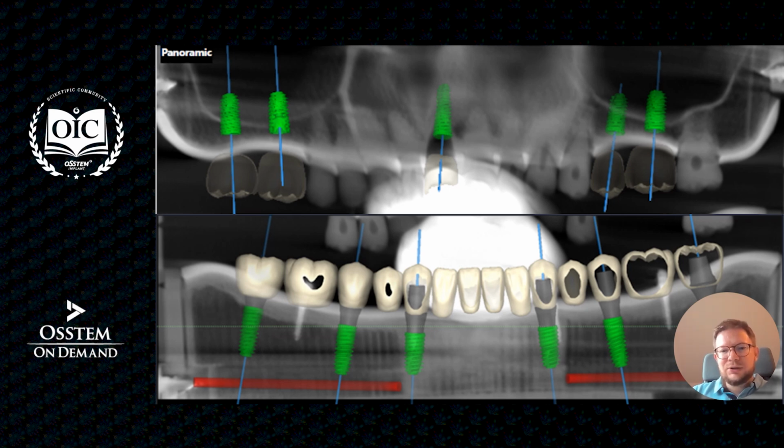To check these possibilities and the workflow coverage, we created two cases. Case number one is the upper jaw, with planning of 5 implants. The incisor is a planning of implantation, and for that implant we wanted to design a temporary crown to finish the case with immediate loading.